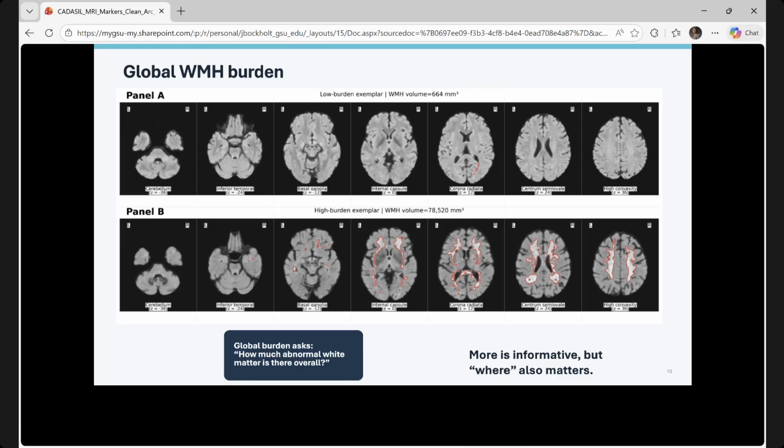You can do that as one value, or you can do that in every meaningful region of the brain. That could be the lobes, the subcortical areas, the cerebellum or midbrain, pretty much any region that you want to look within. You're able to quantify the amount of lesion within that region, and then compare it to other regions, or again, the total brain. So next slide, please.